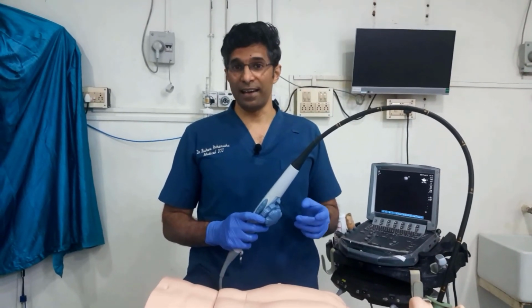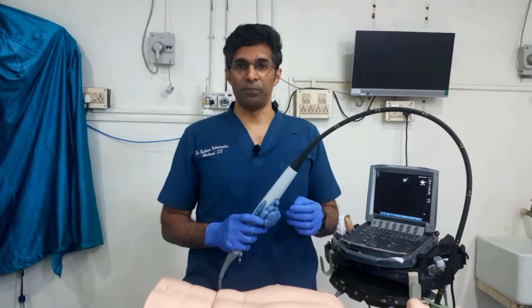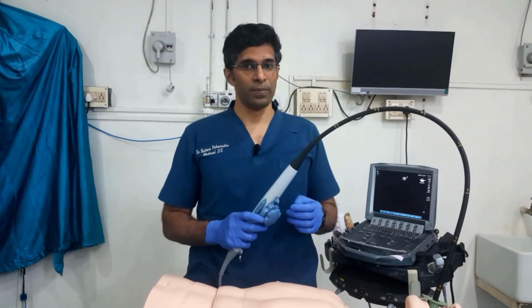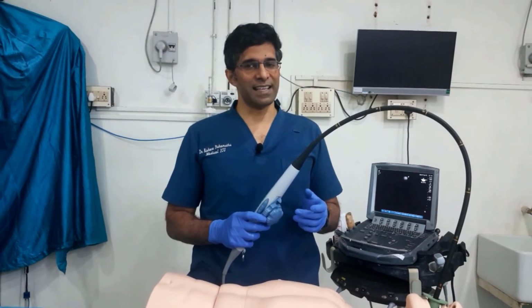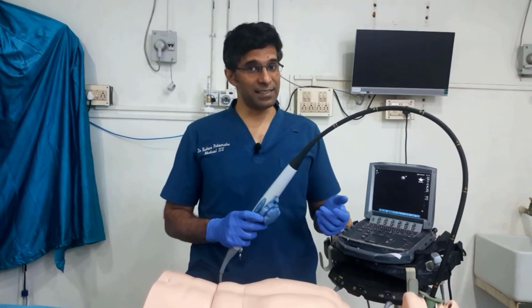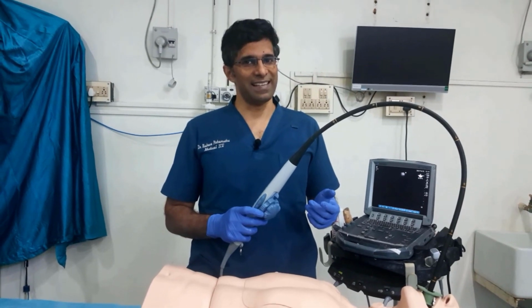And if you've got a TEE lying around in your unit, the next time someone needs an echo, get in on it and use the knowledge that you've gained in this session and practice so that you can become an expert in TEE.